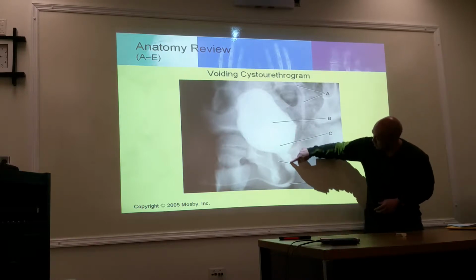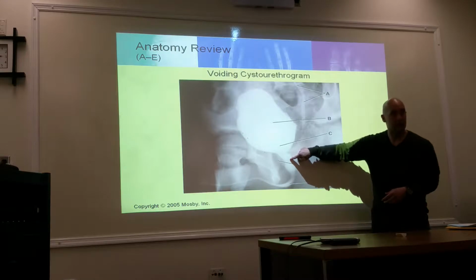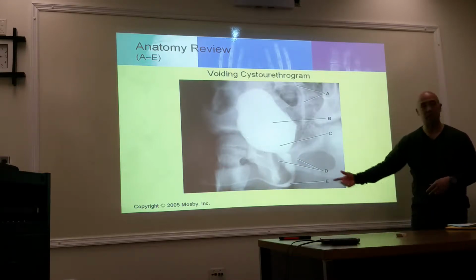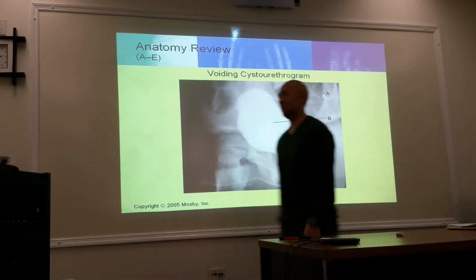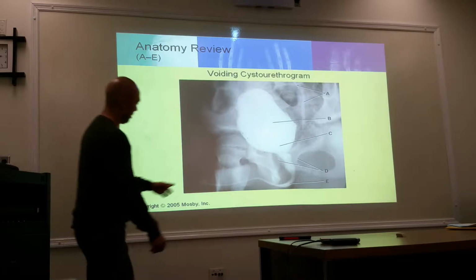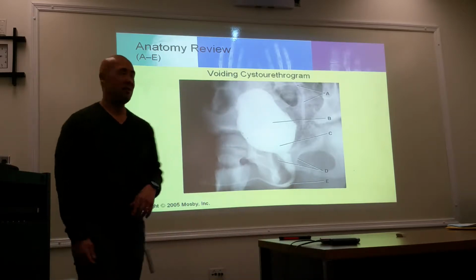What is this area right here? Urethra? Okay. Do we agree this is the urethra? Okay, so this is the urethra, male or female? Male. It looks pretty long. That's a pretty long urethra. So this is male.